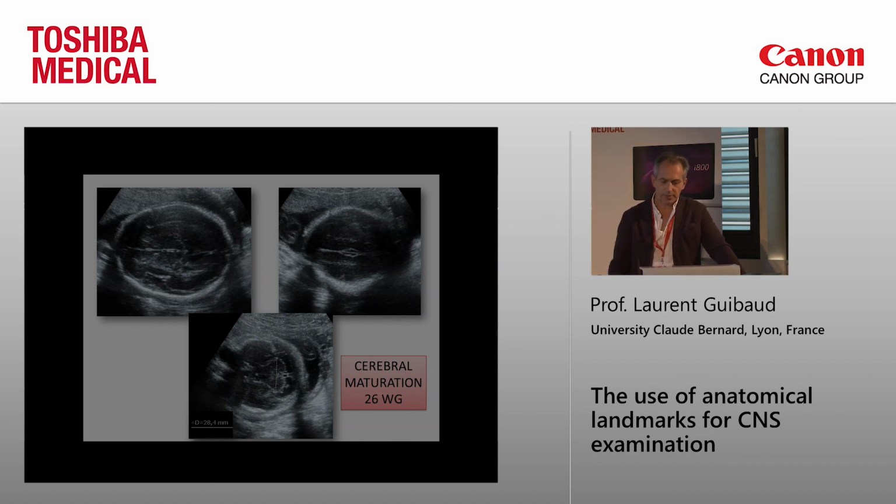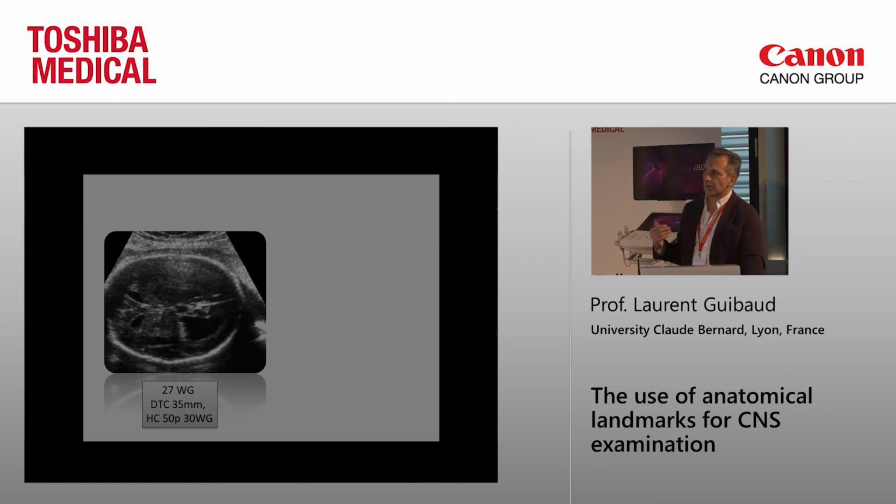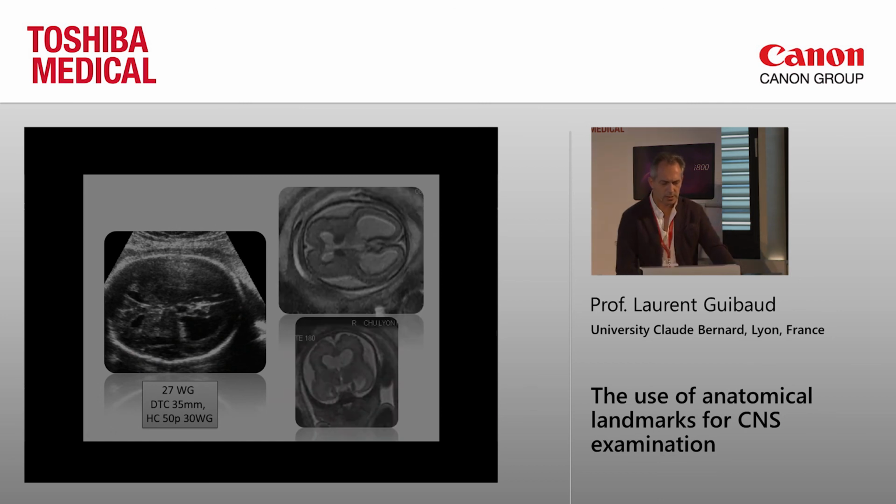In some cases, these patients were referred to us for isolated ventriculomegaly. But if you look at the Sylvian fissure, right away you say it's not isolated. You see? Because this is wide open, it's open like a 20 weeks pregnancy. So this is not consistent with something normal. And we did an MR, and on MR you see you have exactly the same shape. But you see also that the cortical ribbon is undulated, and this is a diffuse polymicrogyria.